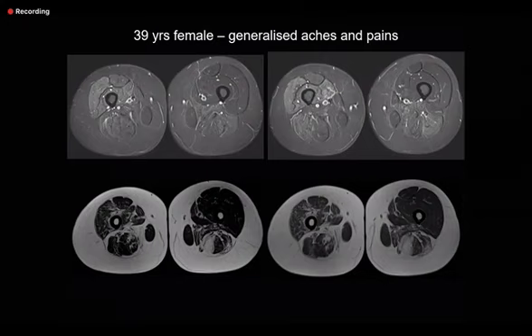In this case, this is sort of chronic myositis, and some of the muscle groups are still actively involved. For example, left thigh and right thigh. Hamstrings, on the other hand, are less involved, and there is a bit of atrophy also. So myositis, please remember, is an exam case.